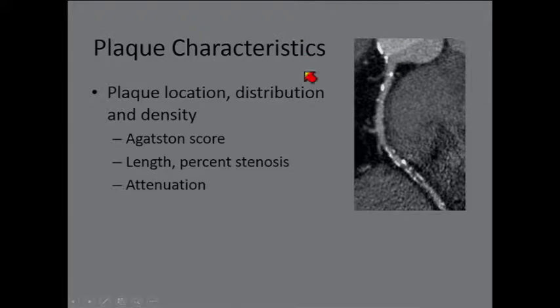And so this is just an image where this patient has a chronic total occlusion of the distal LAD. And at our institution, the cardiologists who are doing interventional work are very interested in having a description of the length of these lesions, the extent of calcification, and their relationship next to branch vessels, which often determines whether or not they'll be successful at crossing this during an intervention.